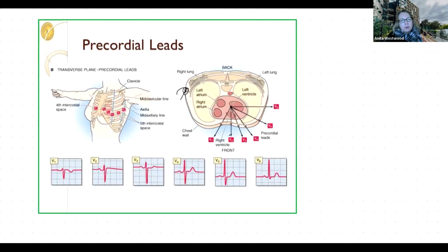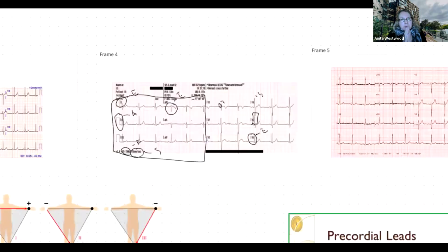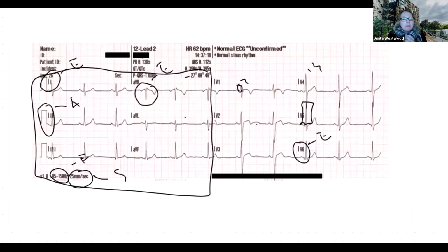For us right now, what we want to think about is we've got a 12 lead image. We've got 12 views or ECG strip here with a rhythm running through. That allows us to look at the depolarization and repolarization from that angle of the heart looking in. So septal, as you can see here, we've got V1 and V2. They're our septal leads, so they afford us a septal view of the heart. V3 and V4 are anterior. They show us the anterior portion of that left ventricle.